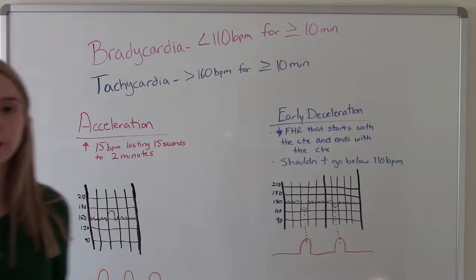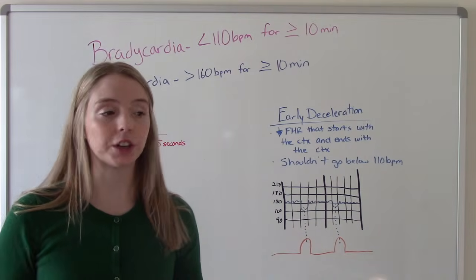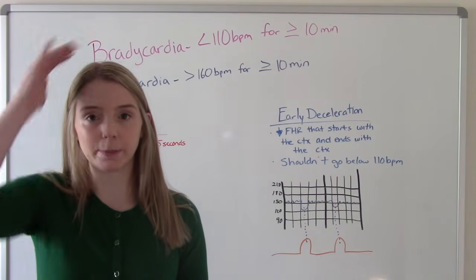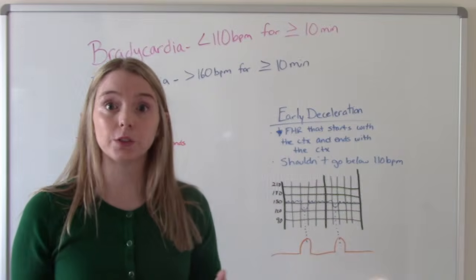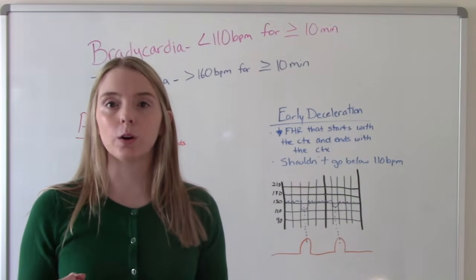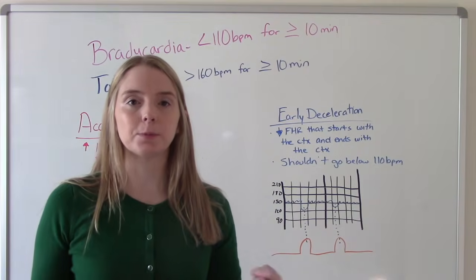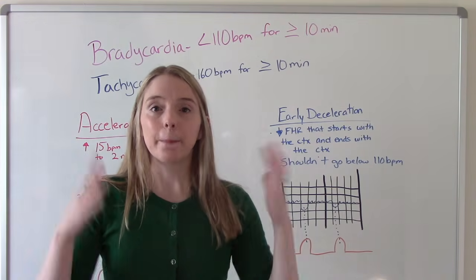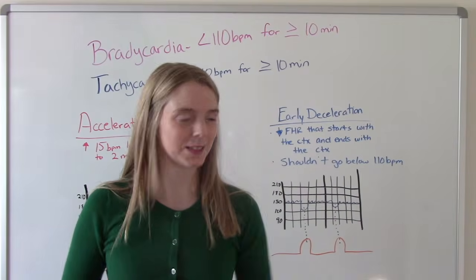When do accelerations happen? Usually when baby's wiggling around, they're changing position. Maybe you, the nurse, have just done a vaginal exam, you've pressed the baby's head, and it's kind of responded like, whoa, what are you doing? So when it gets up and moves around. Maybe you've done some vibroacoustic stimulation, you've taken the little buzzer and buzzed mom's belly and woke up baby, right? All of those are reasons babies can have accelerations. Accelerations are a good thing. We like those.